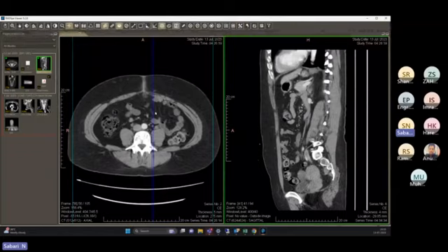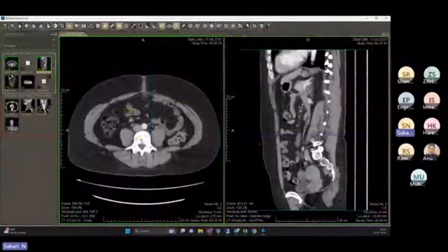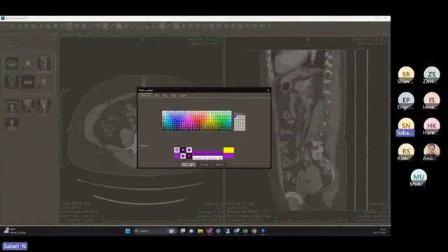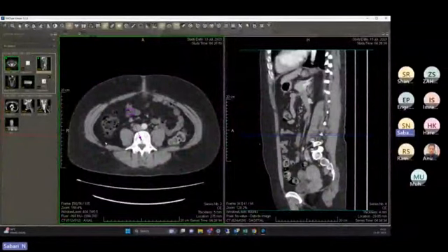If you come back to the text, like when the radiologist has some finding on this, they can mark this and type the text, like a demo. They can change the color of these things, and if they want to increase the size, everything can be done. They can even take a print out, film print or paper print, anything is possible. And the next one is just for arrow marking a line, just for marking a body part.